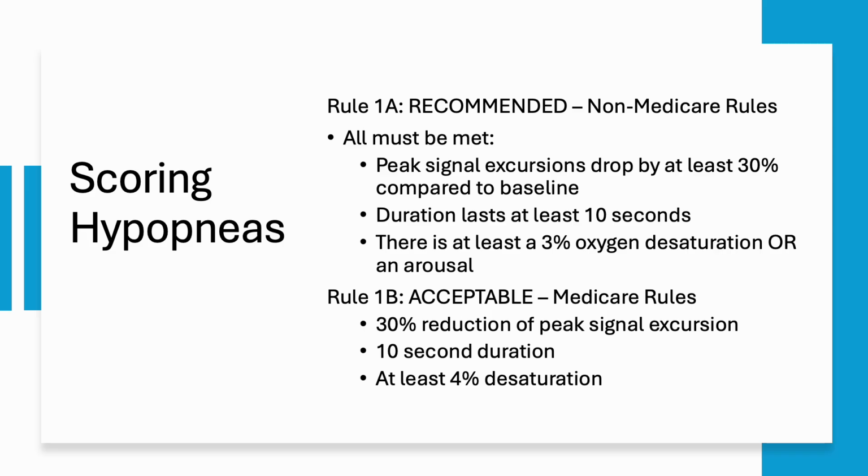Hypopneas are next. Hypopnea translates into under or below, and pnea, which is breath: under breathing. The difference in the airflow signal between apneas and hypopneas is that apneas are 90% signal loss, and hypopneas are at least 30% signal loss. You can figure out roughly what 30% is if you try and imagine what a third of a normal breath would look like. If you look closely, you can tell when the breaths become smaller. It's not a totally precise measurement, but we're looking for a signal drop, just not as much as with an apnea.